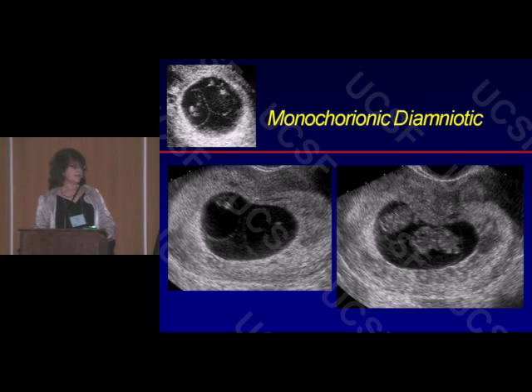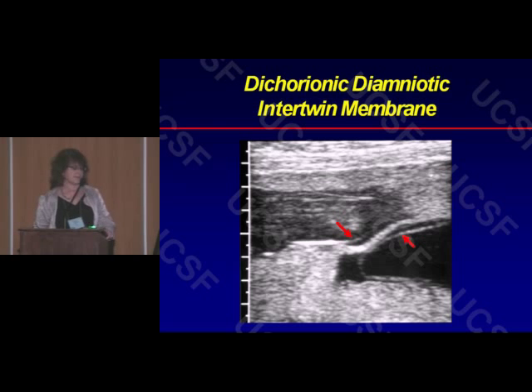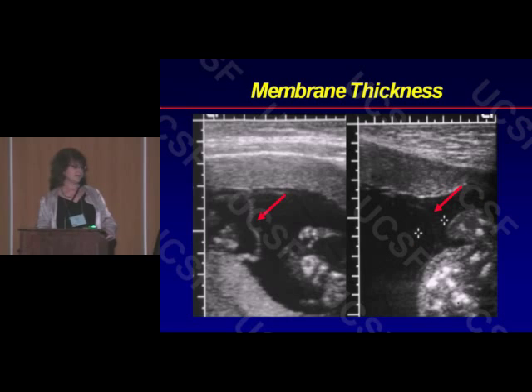echogenic tissue, but internally the embryos are each within their own amnion and nothing else separates them. Over time, those two amnions abut and sort of merge into an appearance of a single membrane, though it really is two layers of amnion separating them. The thick membrane that we see later from a dichorionic pregnancy, should it present later, is actually comprised of 4 layers of tissue, 2 layers of amnion, and 2 chorion, as shown here.